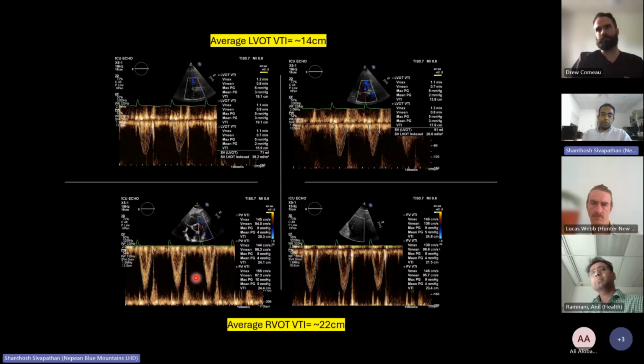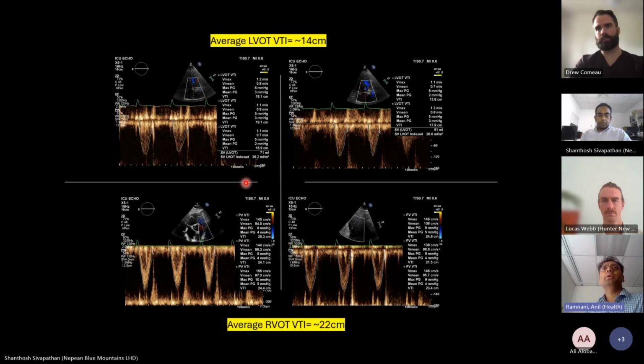If you've got no clicks, no closing or opening click, you're somewhere in the ventricle. If you've got both opening and closing, you're too close to the aortic valve. So just a closing click and a good envelope. You want to make sure that it's at least two-thirds of that segment and that your reject velocity is nice and small. That's a good self-assessment to say whether this is a good LVOT trace, or whether I should do a better one. Does that make sense? May I ask a couple of questions on LVOT VTI?